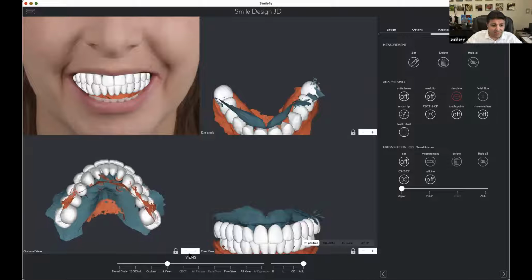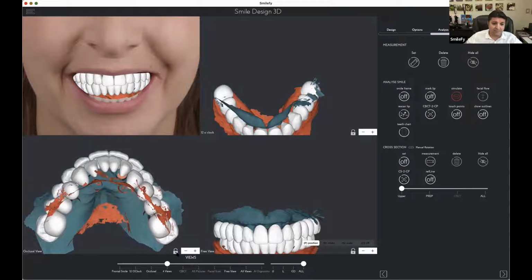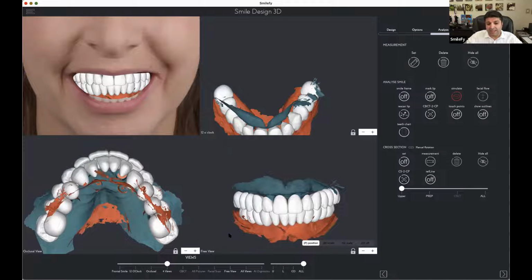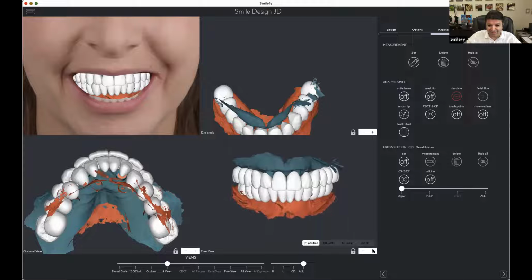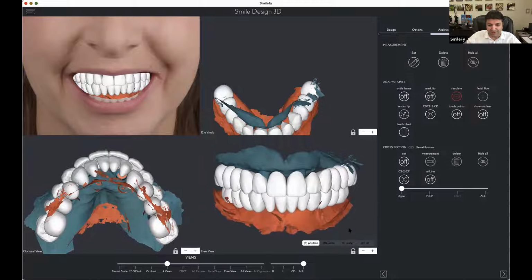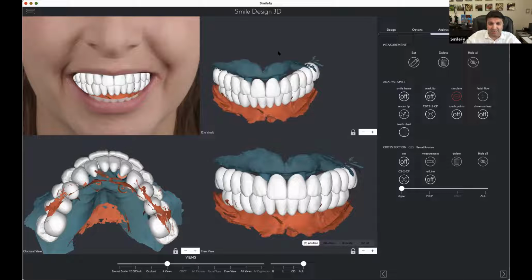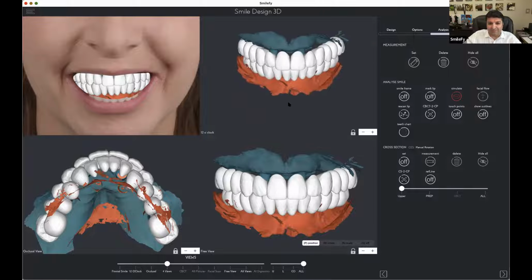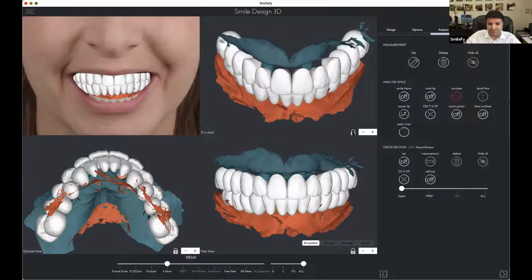And in the morning, when I check this case, I just realized that I'm gonna integrate a new feature, because with every single case we learn something new, and then learning something new we add a new feature, but that's gonna be unbelievably useful, I think. So what do we have here? You see the position of the teeth is good, is pretty accurate.